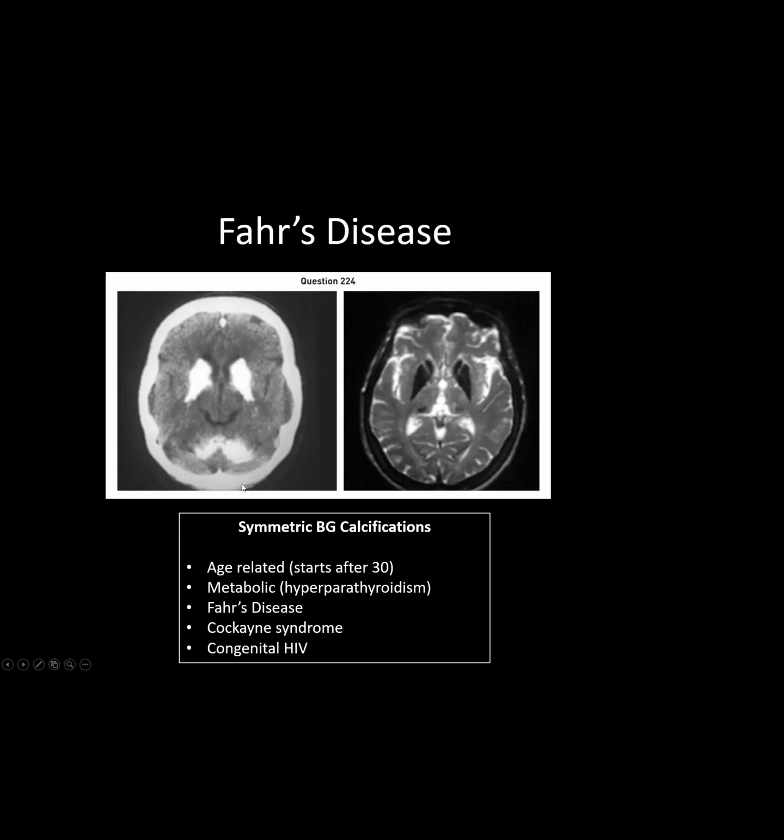Fahr is a big one to think about if you see this appearance on a test. And there's a pediatric disease called Cockayne syndrome that can look like this too. I think if they're showing this on a test, what they're probably looking for is Fahr's disease.